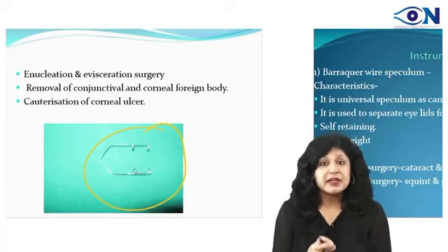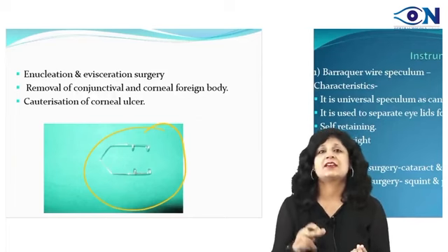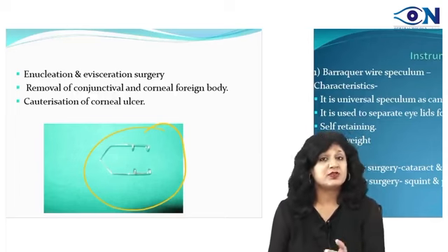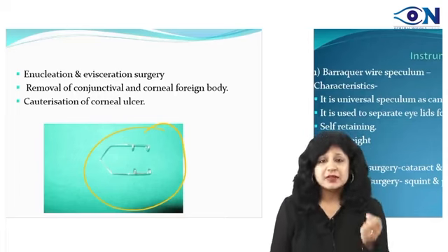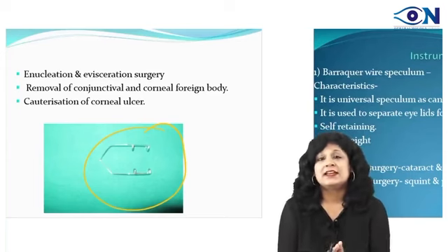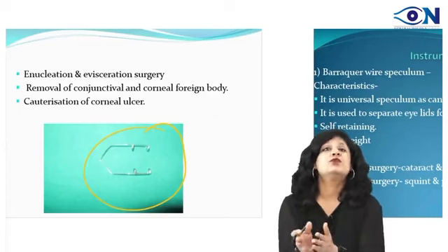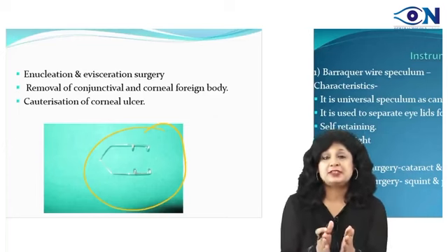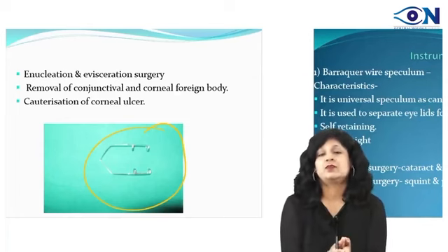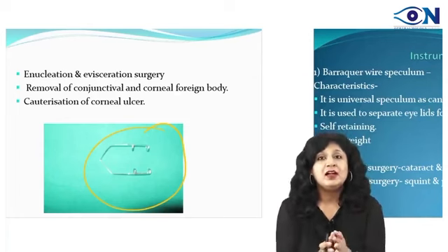So this can be used for the very basic when you are doing the enucleation surgery, the evisceration surgery, the destructive procedures. Then a very common thing that you see in the OPDs, that you have to remove a foreign body. Now what happens when there is a foreign body, maybe in the conjunctiva or in the cornea?